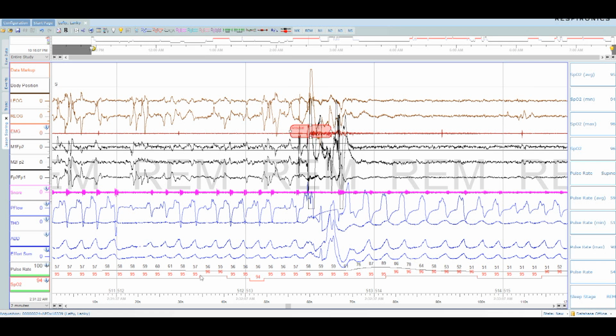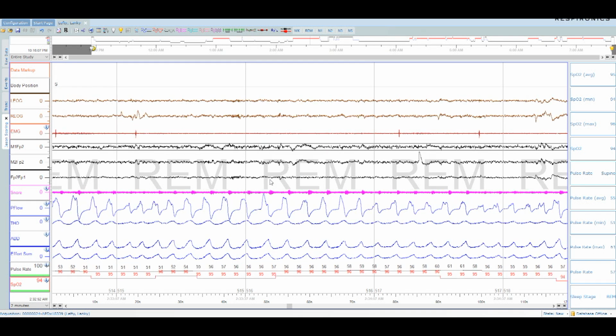So a lot of you might be saying, what about the 96 to 94? That's from this right here. We always have like a 10-second to 8-second delay. It's right about here. So this is caused by this. This arousal is just its own little thing.